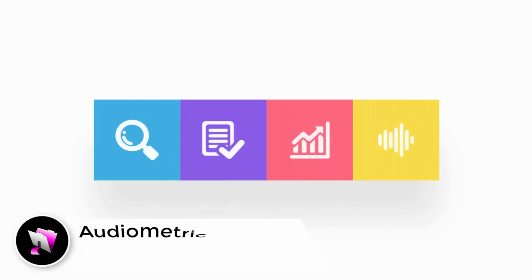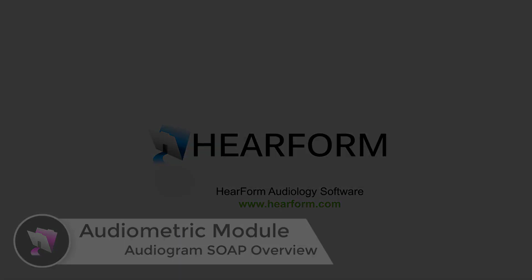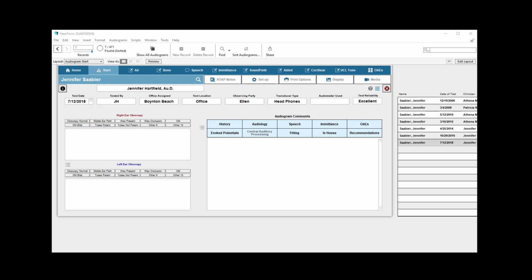Welcome back. This video will provide an overview of the Audiogram Soap Notes area in HearForm Pro. This first video is one of 3 that will explain a little bit about the Soap Notes area within the Audiometric module. Let's go to the Soap Notes area.